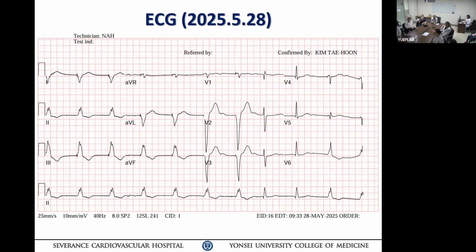It is a pacemaker complex, QRS. You see something gigantic in the back here. What is this? What do you call it? What do you guys usually call it? This is not a T wave, right? This is a U wave, right? Now, if this U wave is appropriate, the next question you have to ask yourself is, is it normal? Because you can also see it in the native complex. And the QT is long, okay? So try to get all the information you can from the 12-lead ECG and put it on the list, and then start making sense of it.